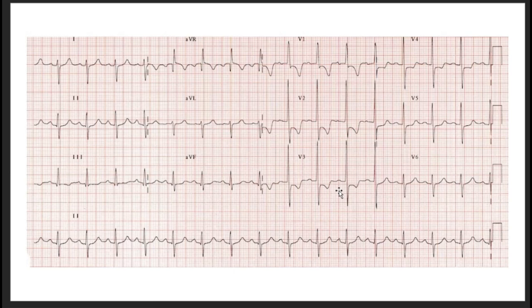So if you wanted to determine if there's left or right ventricular hypertrophy, first of all, check the duration. Is it normal duration or slightly prolonged, like 0.12?